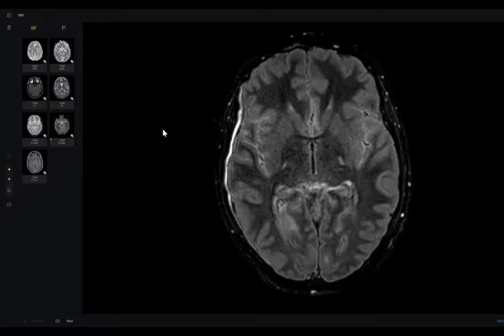I would like to check axial T1 post contrast. No. I told you only one sequence. What is your final diagnosis? Why? Because in the exam, even in a case like this, there is no time to give you about 5 sequences in the spine and 3 or 5 in the brain. I will give you 2 and 2 maximum. What is your differential diagnosis?